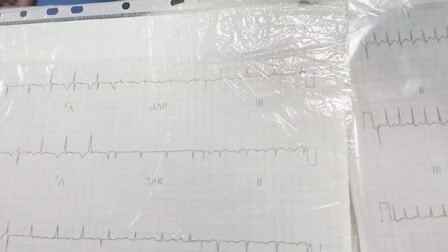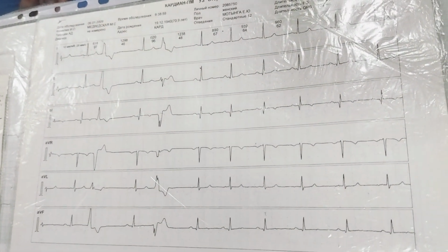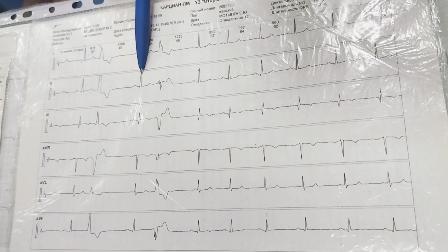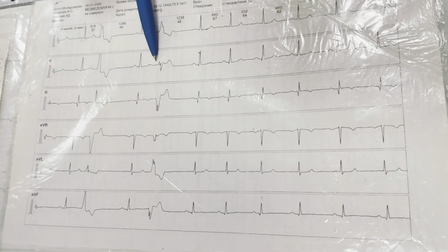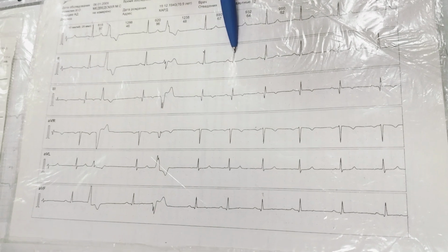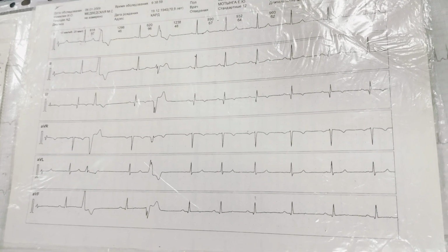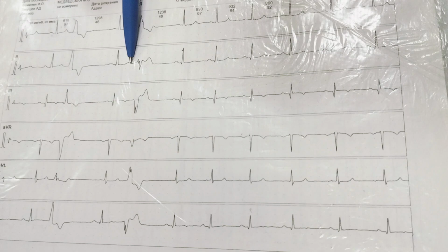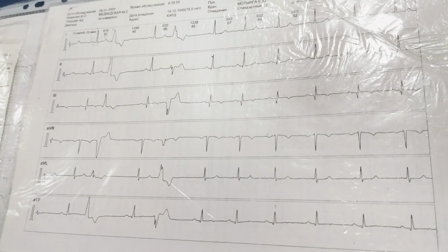In this case, where is the wrong place? Yes, these places are wrong. If you can see a wrong place from a distance, it is ventricular extrasystole in most cases. Let's confirm it. This pause is shorter than the normal one. This one is shorter than normal too. After this complex there is a pause longer than the normal distance, and this complex is wide and deformed. This is ventricular extrasystole. Also, P waves are absent before the extrasystolic complex.